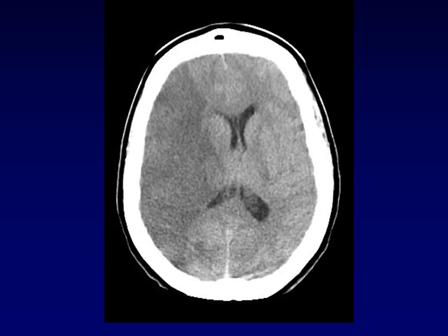In this patient, we have an area of brain that's abnormal. This is the normal brain parenchyma. This is about how dense it should be, and you can see that there is this wedge-shaped, or triangular in cross-section, area of abnormal attenuation of brain parenchyma. It's too dark. Why is it too dark? It's too dark because there's too much water there, and if you mix some of this dark water in with the brain, then it becomes darker on average.